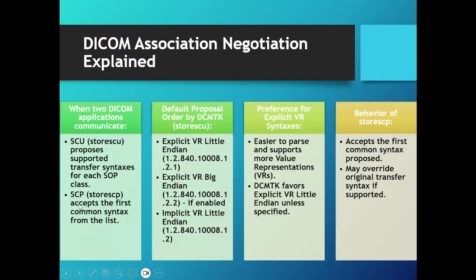And when the storescp receives, it sees the storescu first propose this explicit VR Little Endian, and it is one of the syntaxes it can accept, so it accepts right away. That's why we see the file changes the transfer syntax tag after transfer.